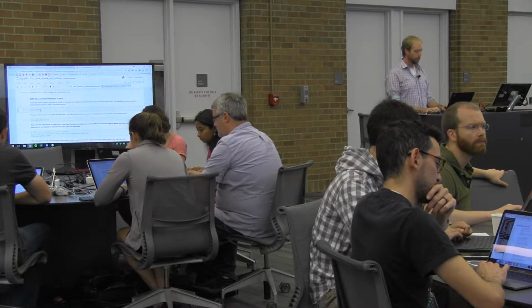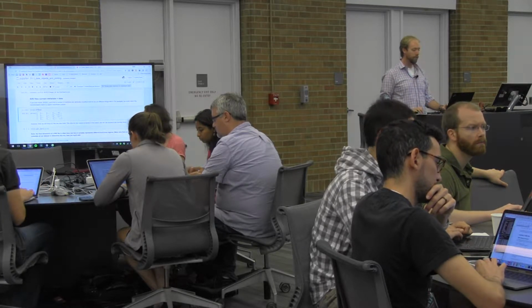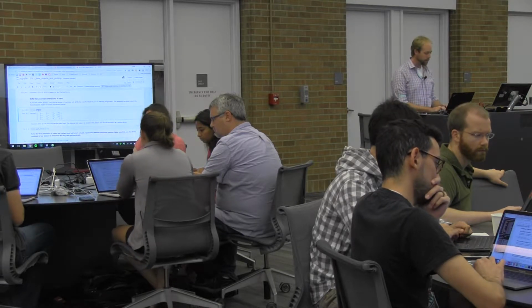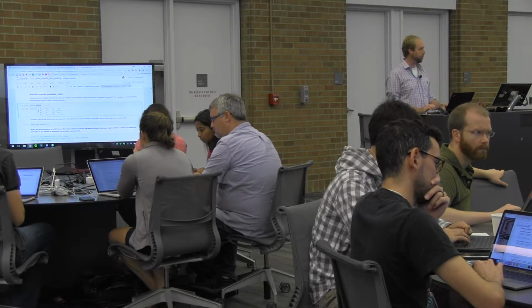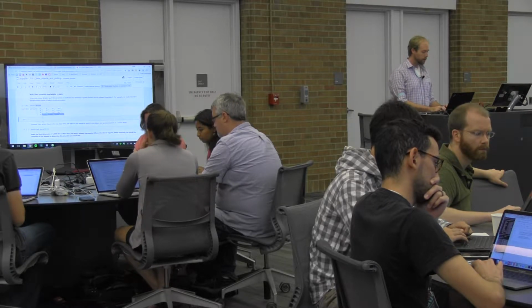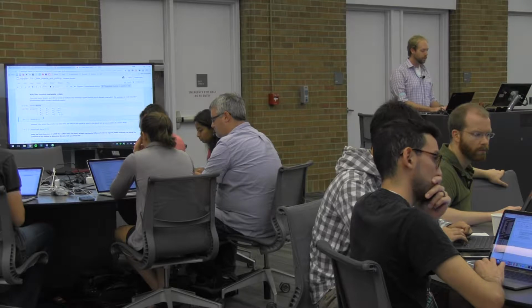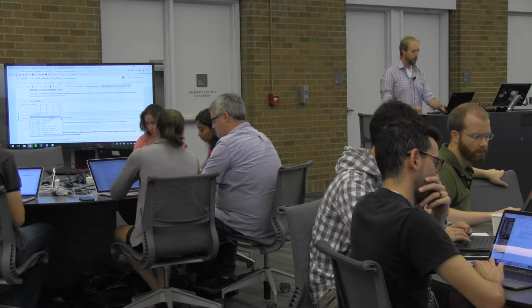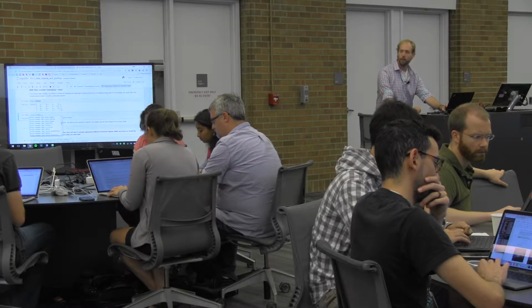So for example, there is usually an affine attribute, which tells you about the affine transform that applies to that data set, so that you can do things like co-register it with other data. There are lots of other attributes in there as well. One that's particularly useful is called the header. And this is another object that has a lot of other information inside of it.